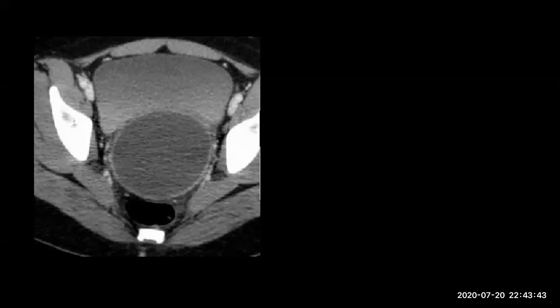What age? Tail gut cyst. It should be posterior, though. Posterior, yes, posterior to the rectum. Okay. Other differential. This is a female patient, by the way. Dilated cervix. Hematocolpos. Ovarian cyst. The differential.